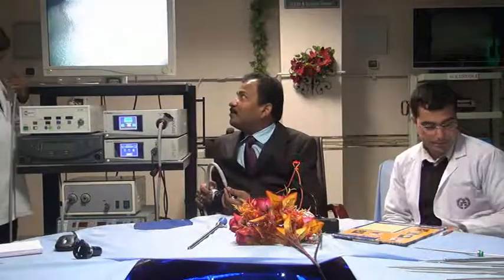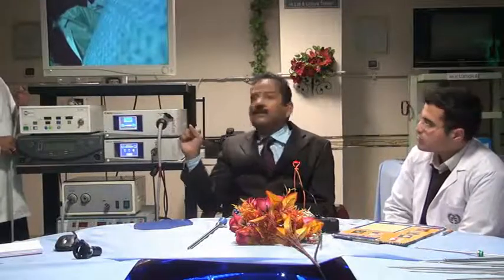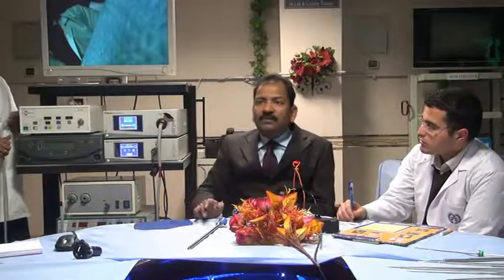So you have to do the white balancing. This was the counter color. And now when you do it, it is also removed. If you clean your mobile phone with betadine, it will always show you yellow because it doesn't have white balancing. Now all SLR cameras have white balancing, cameras where you can attach the lens. Samsung has it. So they have white balancing. Why? So that if something goes wrong or if you have some added impurities, then it can counter the added impurities.